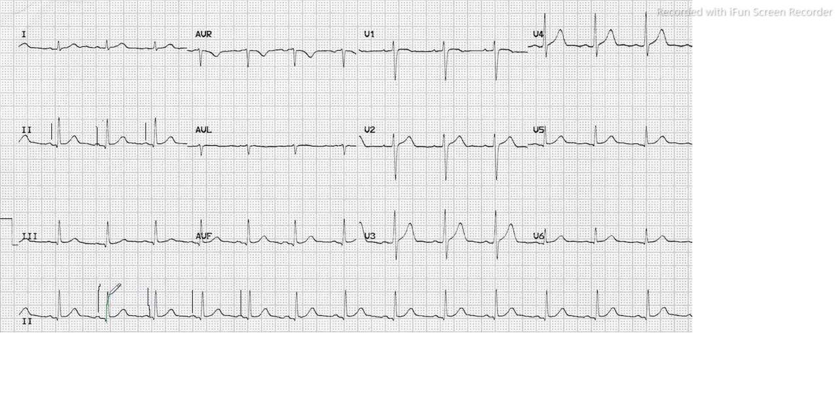Similarly, this is a QRS complex, this is a QRS complex, and this is a QRS complex. You see here that the P wave is coming ahead of the QRS complex. Again here, the P wave is coming ahead of the QRS complex. So always the P wave is preceding the QRS complex. One of the criteria to fulfill normal sinus rhythm is that the P wave should always precede the QRS complex. So this is one criterion.